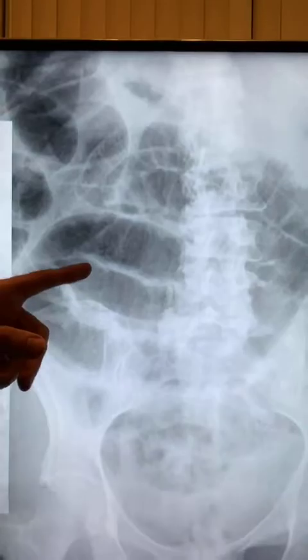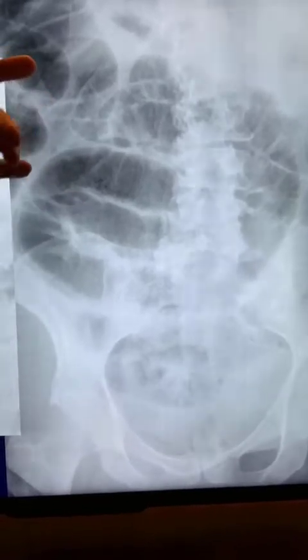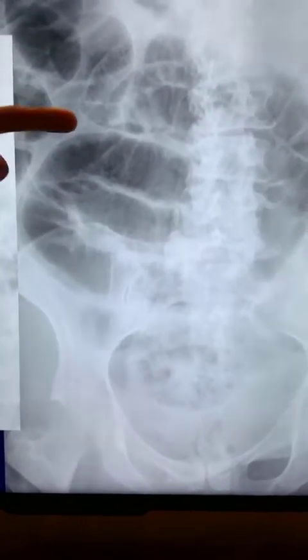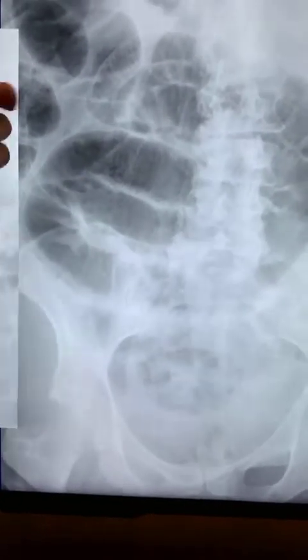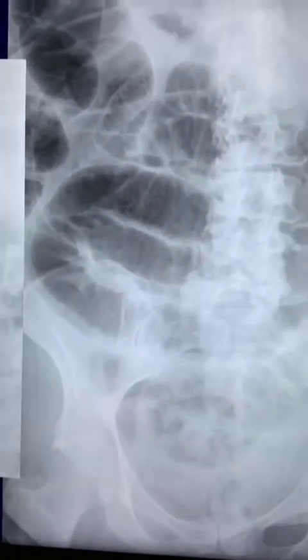Everybody talked about the small bowel loops or some sort of bowel loops, and they said they're dilated, it looks obstructed. And then I ask, is this the most concerning finding on here? The answer is no, okay? Yes, it's obstructed. Yes, they could decompress it, put an NG tube down. If they need to be surgerized, they can absolutely surgerize it, but that's not the most concerning finding.